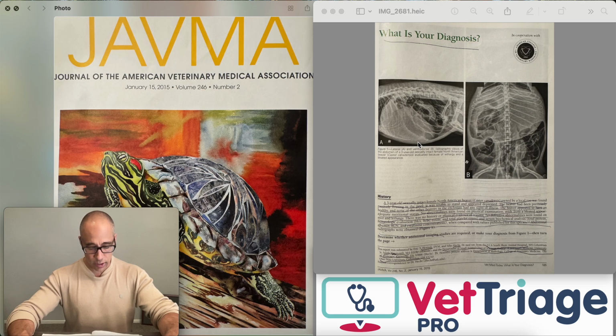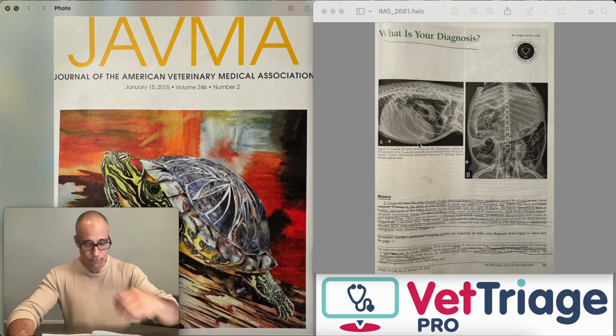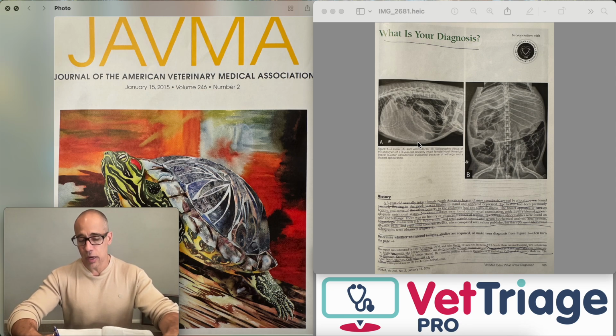Comments. This condition is characterized by vascular or neuromuscular abnormalities within the intestinal wall, resulting in cessation of peristaltic contractions. Although overlap with radiographic findings in obstructive ileus exists, paralytic ileus should be the primary consideration if there is extensive uniform rather than focal intestinal dilation. It is unknown whether the paralytic ileus was caused by septicemia or the sepsis was secondary to the ileus in this patient. Paralytic ileus is believed to be the result of activation of inhibitory neural reflex pathways and activation of inflammatory processes. Septic shock can severely impair GI function.